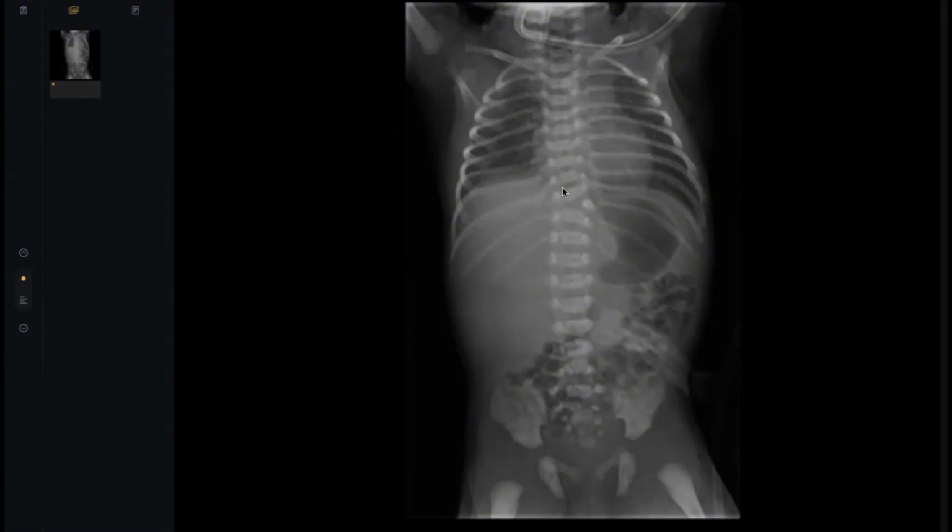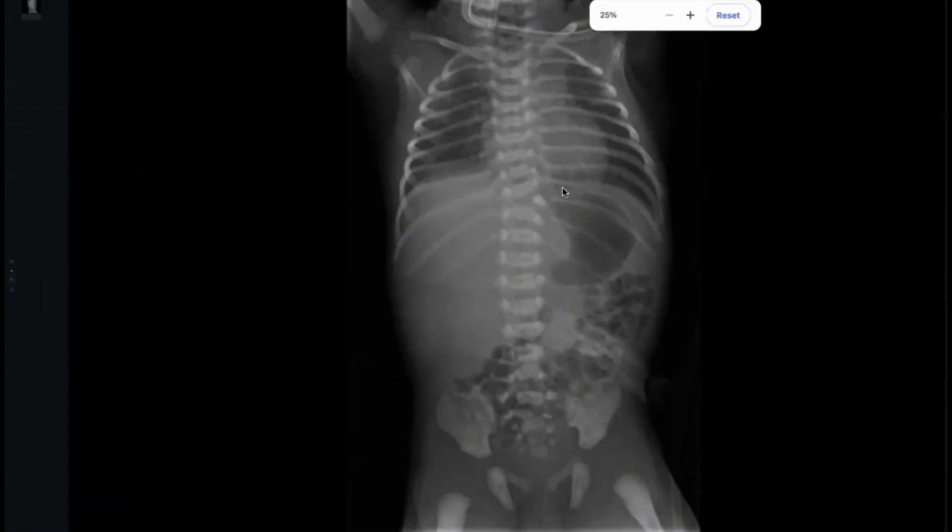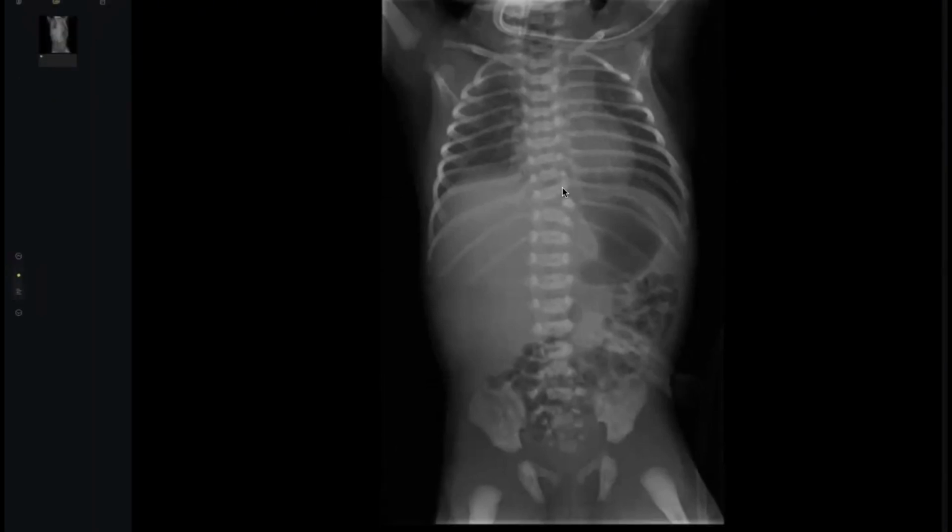Which anatomical location? In the upper neck. Okay, excellent. I think in the upper neck. Okay, maximum zooming, by the way. You are correct. I believe that this may be so, but this baby is routine, and I'm not sure why this tube is here. Maybe this is a nasogastric tube or endotracheal intubation.